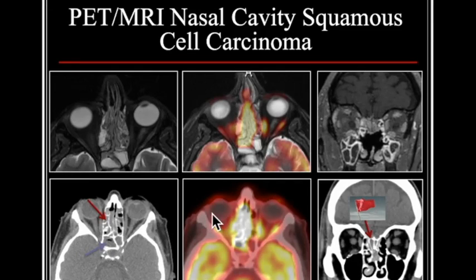But I would point out on the initial images, we did see a red flag finding that the patient had isolated olfactory cleft opacification, which is something that we should be thoughtful of. Obviously, that's sort of the last place that usually opacifies. So if you see opacification in that area, first of all, you need to be thoughtful about that and potentially do a little more workup.